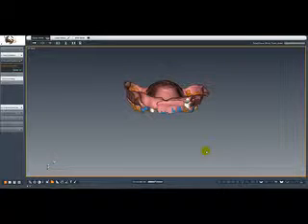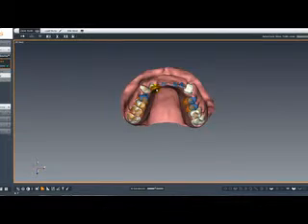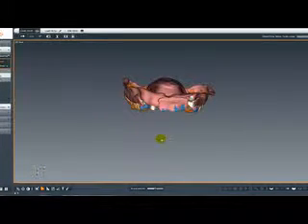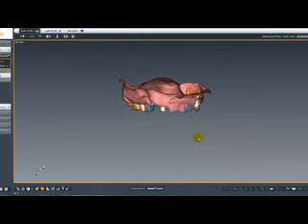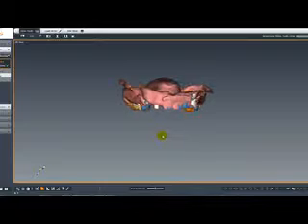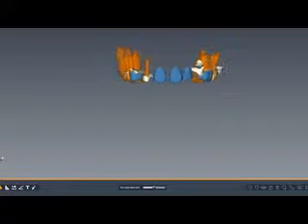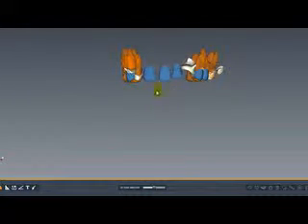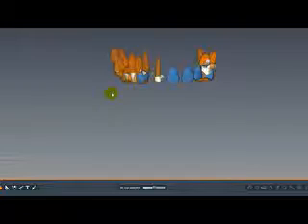So in the reverse engineering process, we went ahead and just utilized the partial denture as the AP position for the teeth, to dictate the AP position of the teeth pretty much. We segmented the roots of the posteriors and the ones that are existing, and then we added some more teeth in there. Let me remove the tissue area right here, and as you can see, this is the area where we added some teeth. I added 8, 9, 10 area there, and then here are the existing roots of number 11, number 6, number 7, and then all the other ones.